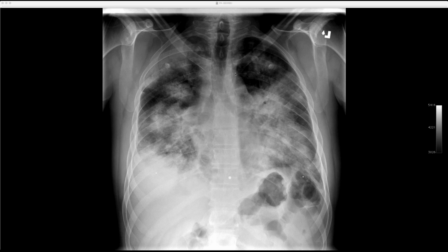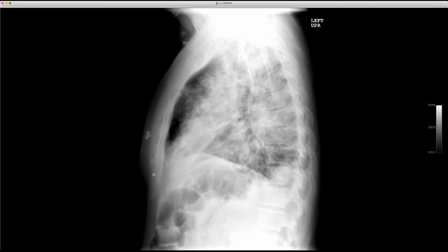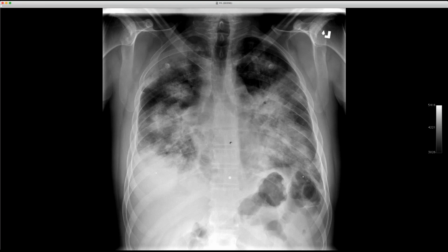You can see there's multifocal lung consolidation. Here's the lateral. You see a really nice demarcation of the upper lobe. Nothing that looks pleural. It has a normal heart size. So obviously infection would be high on our list. Some sort of drug toxicity, but as far as I know, he wasn't on anything for his asthma other than inhalers, but had been having some trouble.